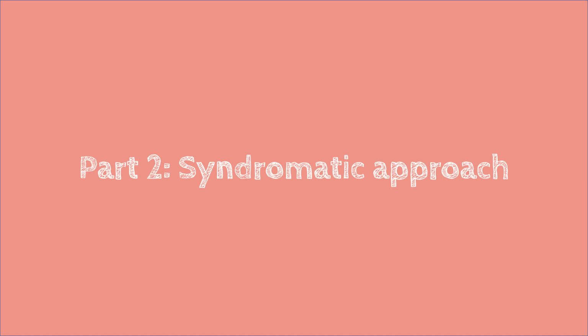I think with a bit of practice, it's quite easy to go through this, and this becomes kind of system one. Usually, I forgot to mention, I look in lead 2. But of course, you need to look at all the leads for pattern recognition, but stuff that is in one lead should also be in the other leads, right?